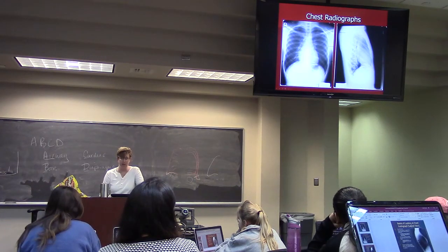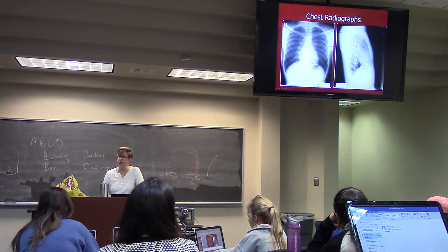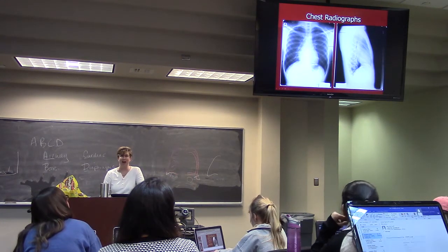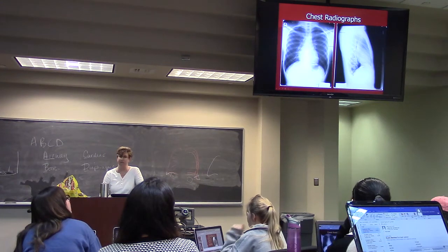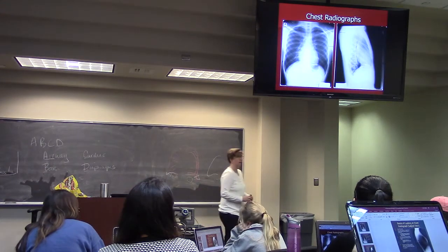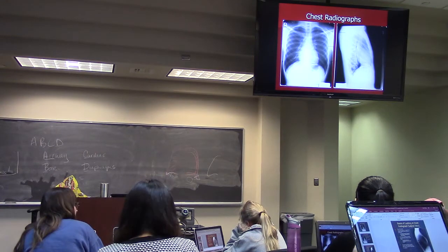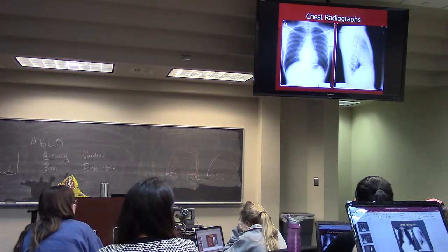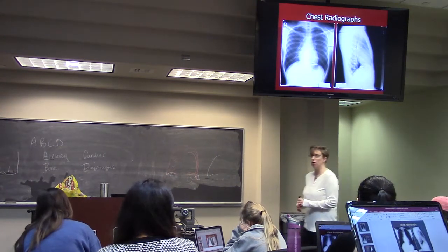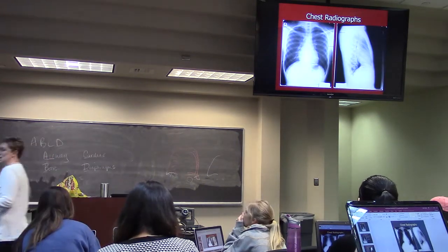So this is an example where you can see that behind the heart, these vertebrae do not get blacker. There's an infection or pneumonia here. You lose that lucency. And so there's a pneumonia in the lower lobe. Right or left? Don't know, because if we're just looking at the lateral, we've lost that lucency, that darkness, blackness behind the heart.